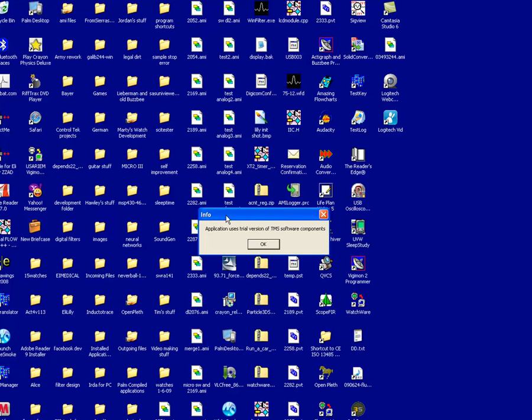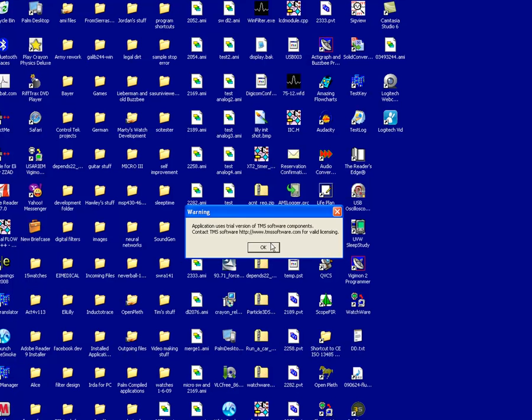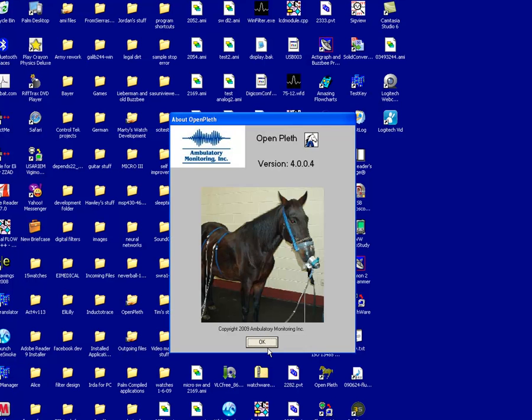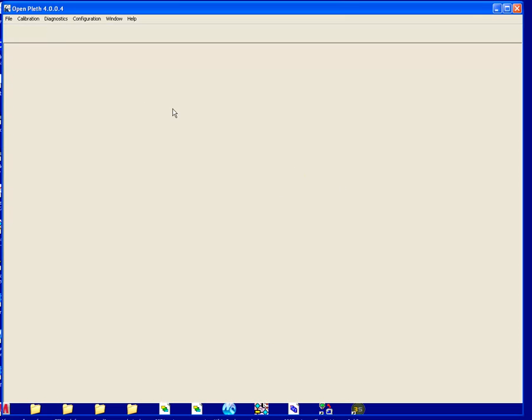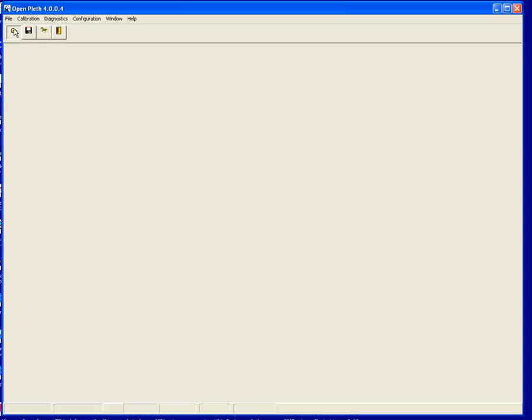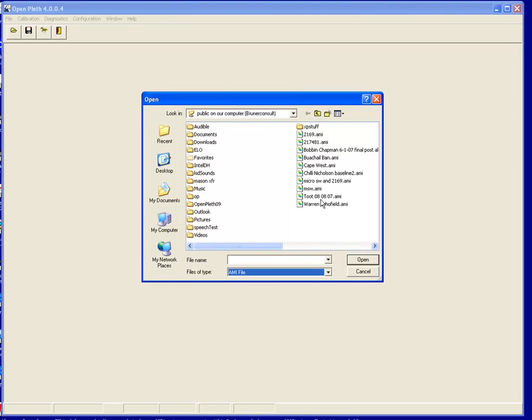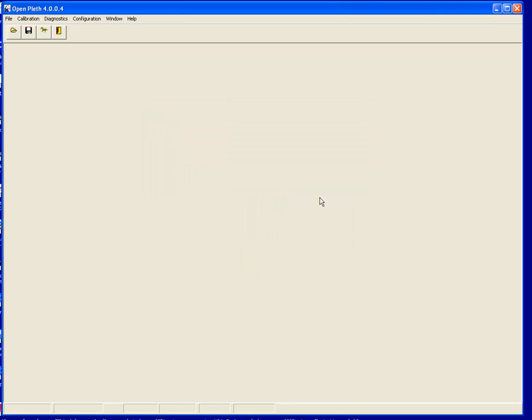As usual, until I get the versions of the new components, we're still going to get this informational block here, and I'm not attached. So what we're going to do is load up a file that has negative delta flows. Still an AMI file, and what we're looking for is the 2.1.